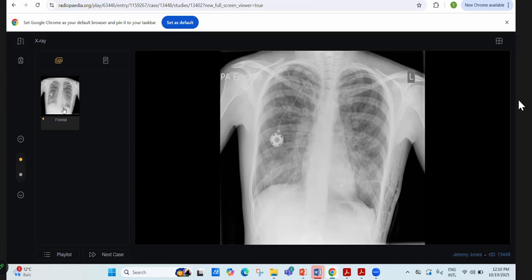If there is a history of trauma, I would look for it. There is no history of trauma. There's also mild tenting of the left hemidiaphragm. There are also patchy cystic areas in the bilateral hilar locations and reticulations as well. This can be a secondary pneumothorax, secondary to some cystic lung disease. I would compare it with the previous imaging as well, if available, or further advise HRCT lungs.